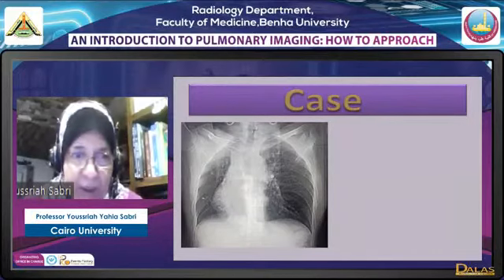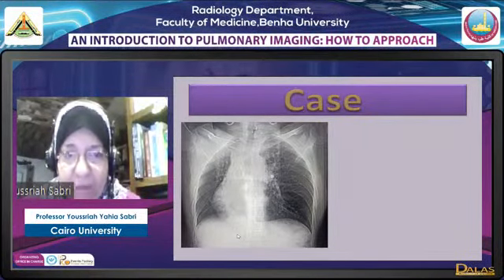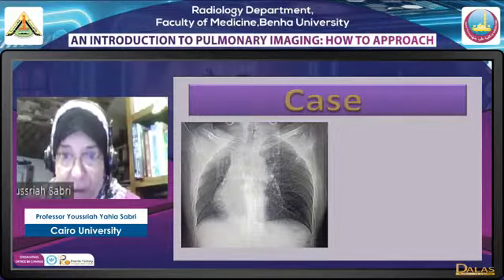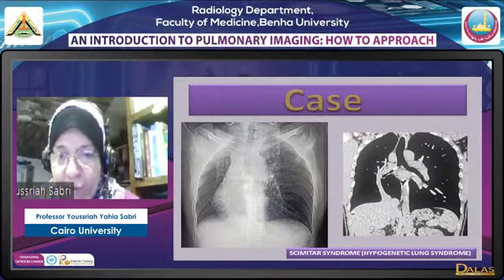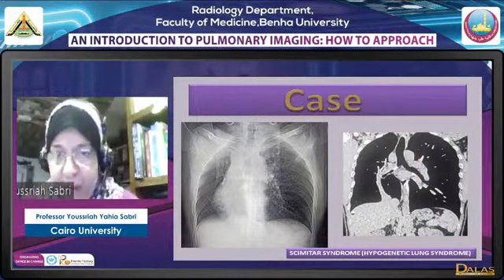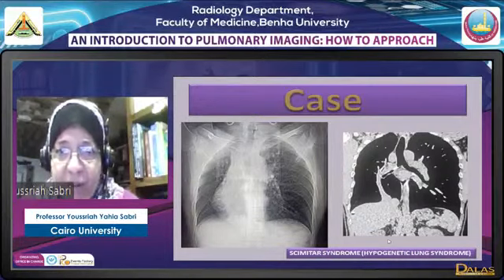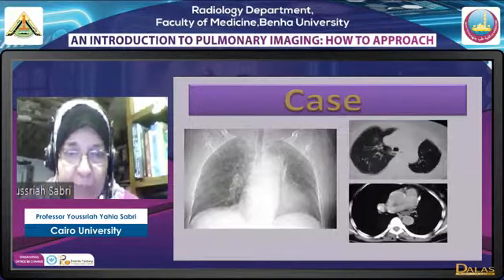Another case here, we have again a small lung, shift of the mediastinum and heart, abnormal configuration, and as you can see here, there is a suspicious vascular structure behind the heart here, okay, scimitar looking actually. And this is a coronal image. This is scimitar syndrome, what we call a hypogenetic lung syndrome, which is considered as partial anomalous pulmonary venous drainage. Again, a small hypoplastic lung.